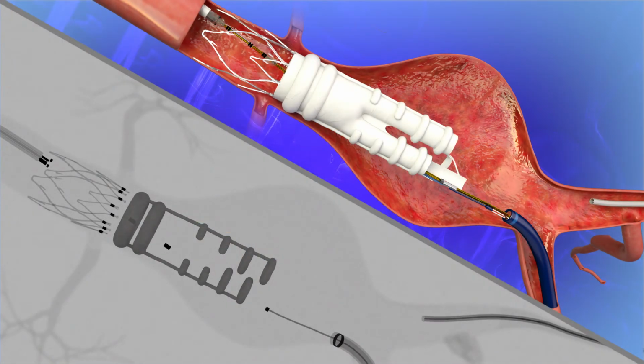As the polymer cures, cannulate the contralateral leg of the aortic body with the guide wire. The offset aortic body legs and the connection between the legs and the delivery system ease cannulation.